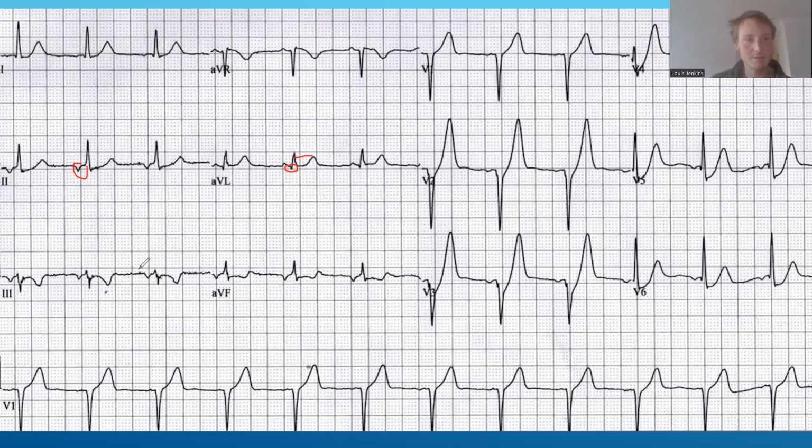But yeah, we've got another inverted P wave in lead 3. That's unusual. We've got a bit of an unusual looking S wave. It's very narrow. And then we've got T wave inversion and what looks like a little bit of ST depression in lead 3. Same sort of pattern going on in AVF with an isoelectric T wave. A lot of pretty unusual but non-specific changes, I'd say, happening so far.